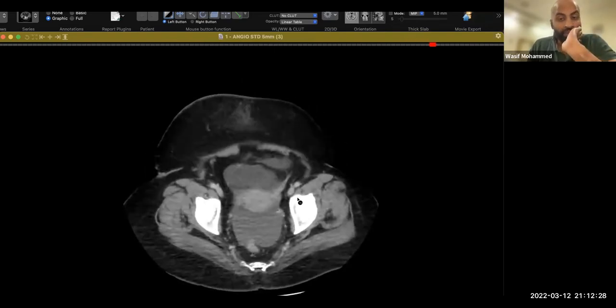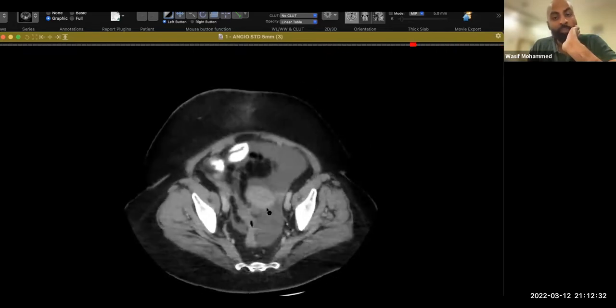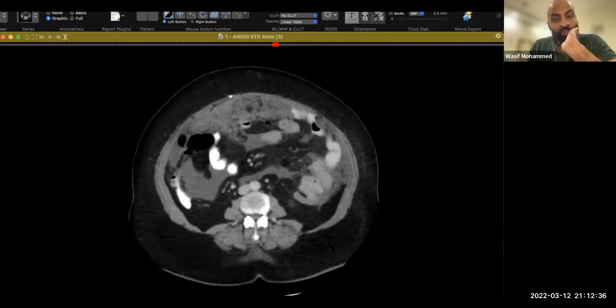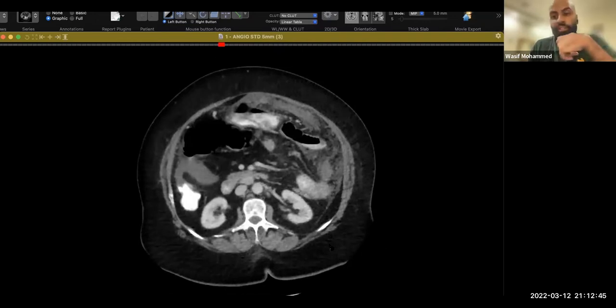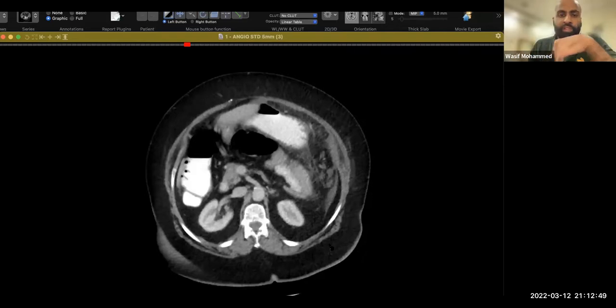So you need to say there are no pelvic masses, there's no abnormal bowel wall thickening anywhere, and there's no calcification. These would put you in the realm of appreciating your differential diagnosis. And then you need to bring in the clinical history, so I would correlate with the patient's clinical history. Usually when you say this, the examiner will give the history on his own.